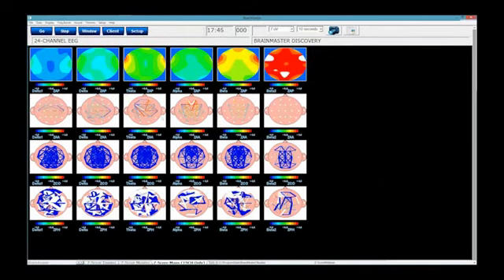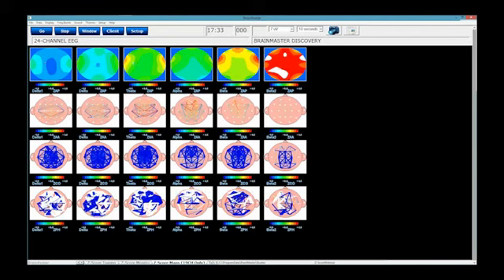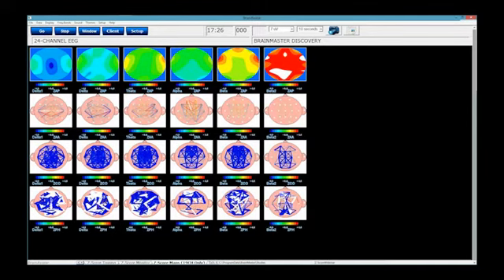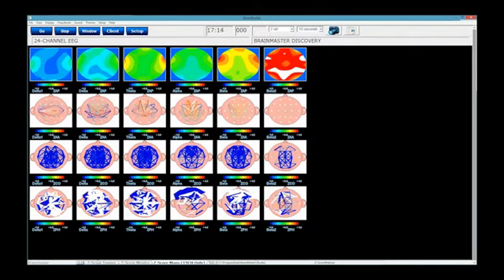But as you can see, it gives me a good overview of where the numbers are. You're going to notice your colors are the same, with your color palette scale right down here. The same color palette scale holds down here. The only thing that's a little bit increased is that the higher the numbers get, the thicker those lines get too. As they get bigger and bigger, you'll see them growing a little in size. That's what's going on right there.